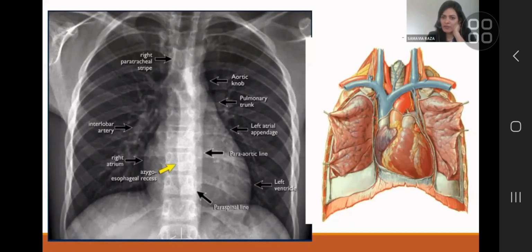What is normal? 3 millimeter may be normal for me, but not be normal for Dr. Khan. It depends on your height, your age, your weight, and your general health. So it's very important not to get hung up on the exact centimeter or millimeter that something needs to be from a distance. So if this patient was lying down a bit more or reclining a bit more, this line could move a bit laterally, and that's still normal.